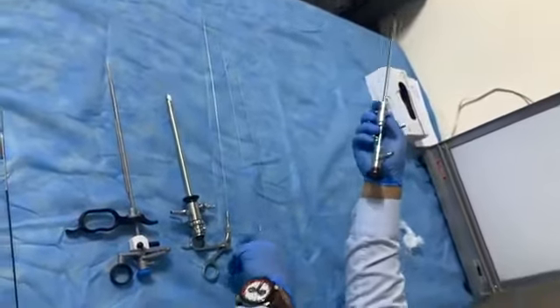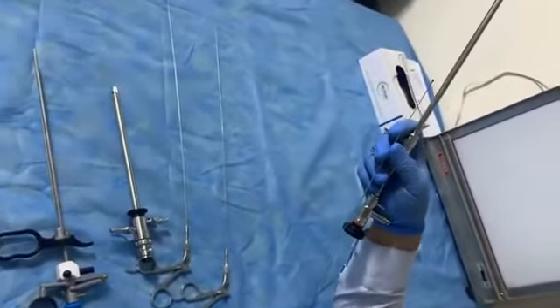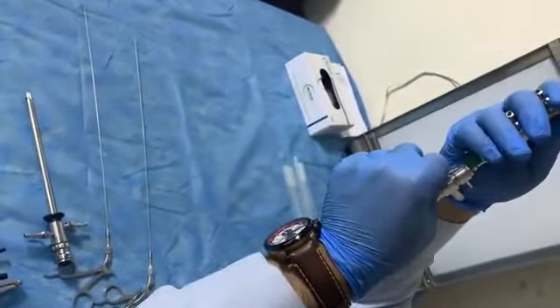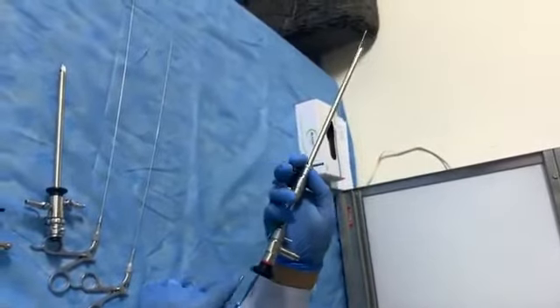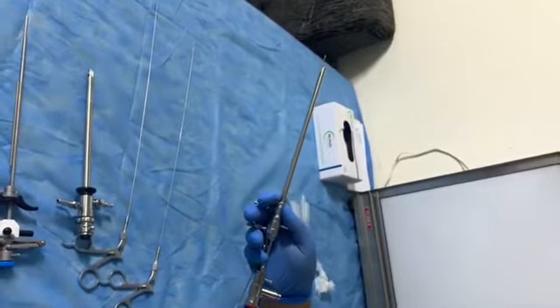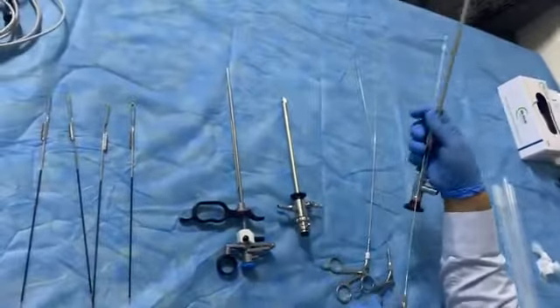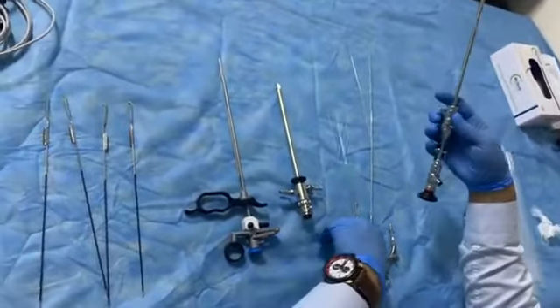And also there is another instrument for biopsy. This is a grasper. This is for taking a small piece. It is for biopsy, so put it from this side, to take a small polyp or to take a biopsy outside the body. And this is another instrument, also small, for taking a puncture from the uterus.